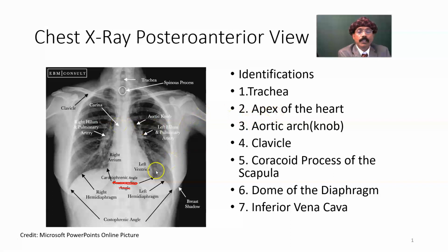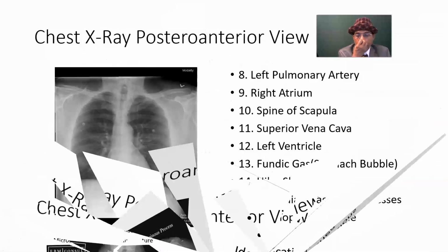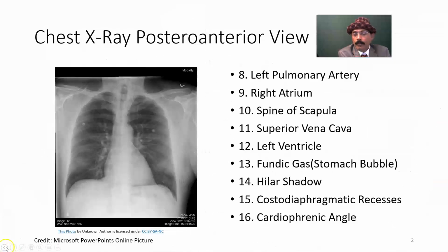This is the apex of the heart here. The apex of the heart is formed by the left ventricle. So this is the left ventricle, and this is the apex of the heart. Okay, we got that. Then we'll go here.